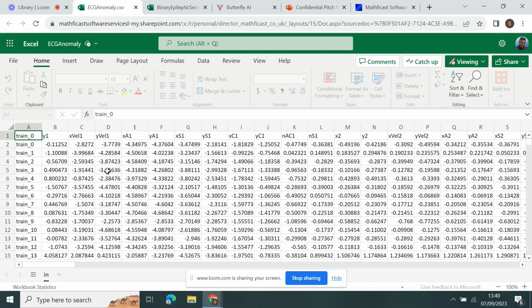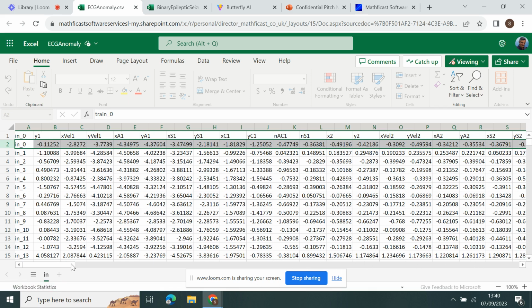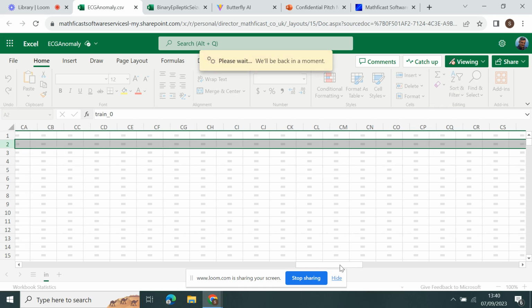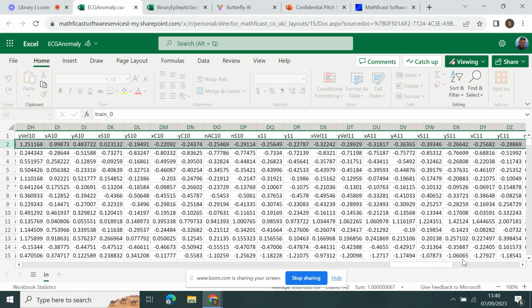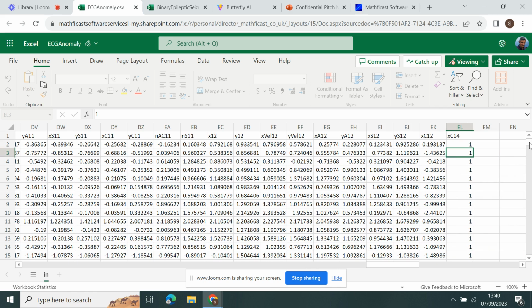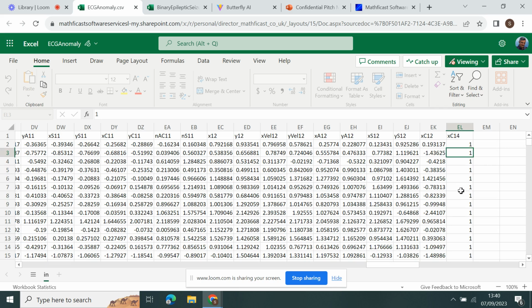Now, this is data for ECG anomalies detection. Each row of this data is a time series showing an ECG signal frame. The last column of this data represents what we know as the label, and by looking at this label, we can realize if the frame has an anomaly or not. Label 1 indicates that we have an anomaly within this ECG signal.